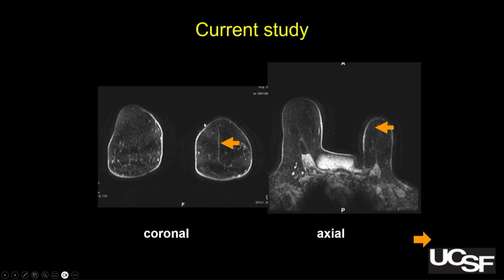So I'm going to lead you a little bit. Looking at this, notice how bright the skin is here. That's not pathology, that's just an artifact. It's really close to the coil, and for some reason, the medial coil elements are really making the medial aspects of the skin look super bright.